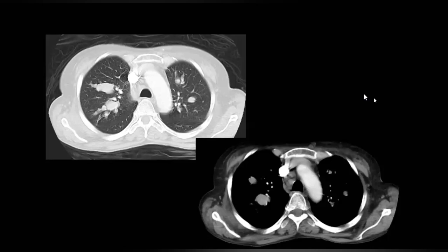What is the clinical picture of these patients when they come? I mean, they have to ask me about one single condition that coexists with allergic bronchopulmonary aspergillosis. Do you know what it is? No, I can't think. Asthma. Asthma, yes. In general, asthma doesn't cause any major problem on X-rays, maybe hyperinflation. But if the patient is asthmatic and you see bronchiectasis, it is ABPA until proven otherwise.